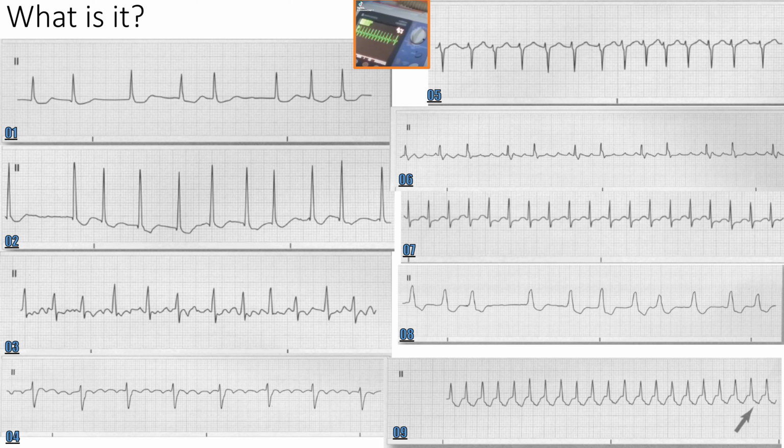All right, so the reason why it is AFib is because, A, it's irregular. You've got irregularities in these intervals here, and you really can't see the fibrillatory waves, but if you had to guess, this is AFib. Next semester when we learn about junctional rhythms, they don't have P waves either, but junctional rhythms are regular, so that's one of the ways we can tell the difference. But if you have an irregular rhythm, it's probably AFib, all right?